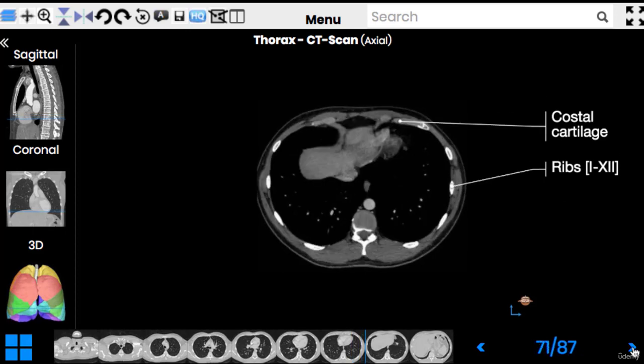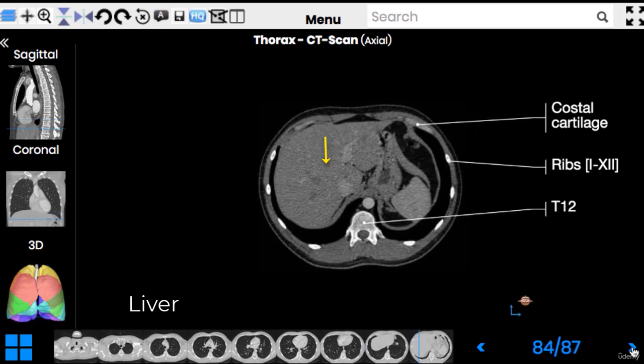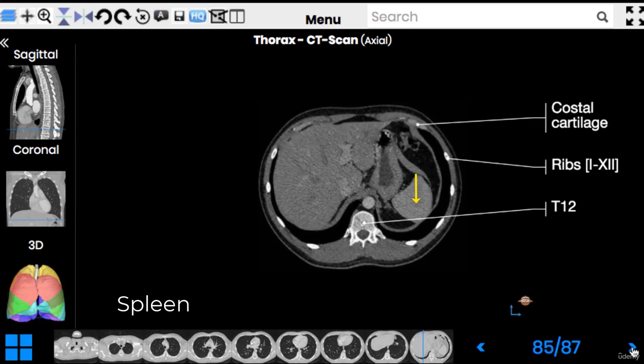As I descend down, there is some grayish structure on my right. This is the right dome of the diaphragm. We have the liver now on our right, the spleen on our left, and this hollow organ between them is the stomach, which has some bubbles, the air in the upper part, as you see, and there are some contents like fluid inside as well. This vessel behind here is the abdominal aorta.